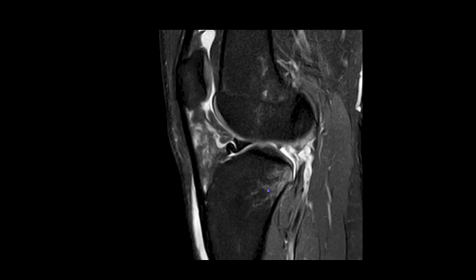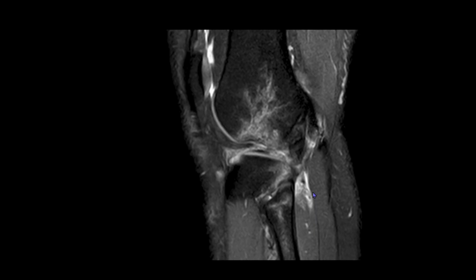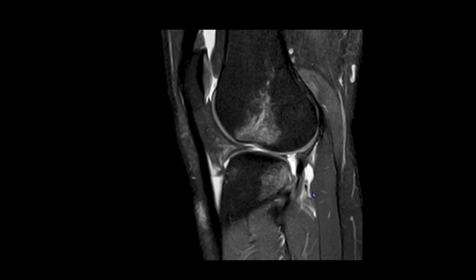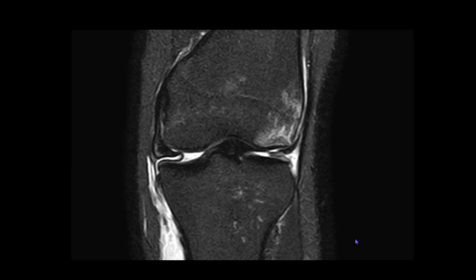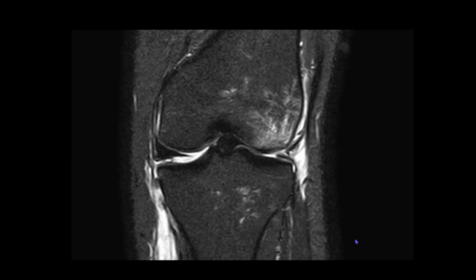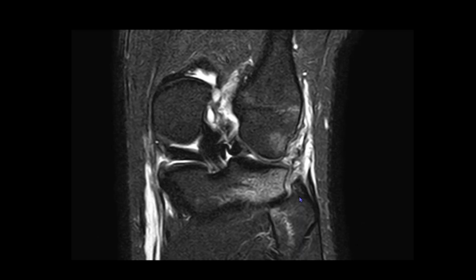Now coming on to the lateral aspect, when we go towards the periphery, there should be the normal bow tie appearance of the lateral meniscus, but we are not able to see this. This occurs only when there is a bucket handle tear. A bucket handle tear is a type of tear where the anterior and the posterior root attachments of the lateral meniscus are intact. However, the rest of the meniscus is torn from the peripheral third, so the peripheral third would be intact and the rest of the meniscus would be flipped inside, and it would be seen in the intercondylar region.